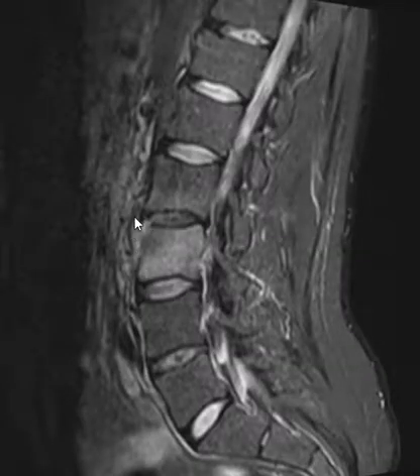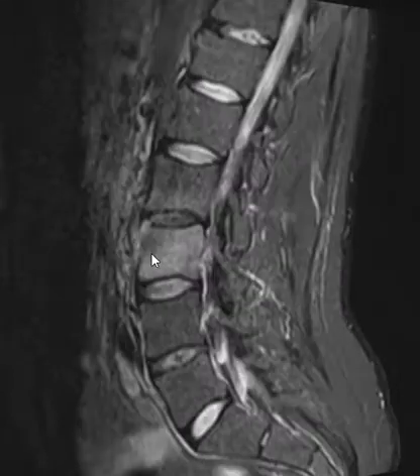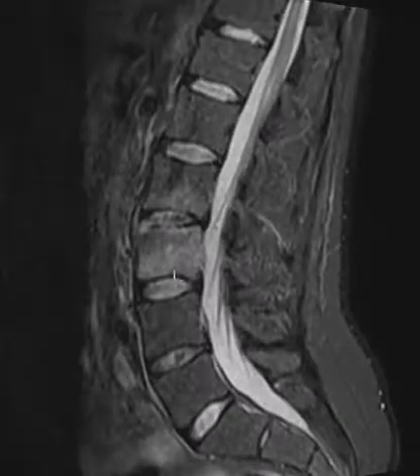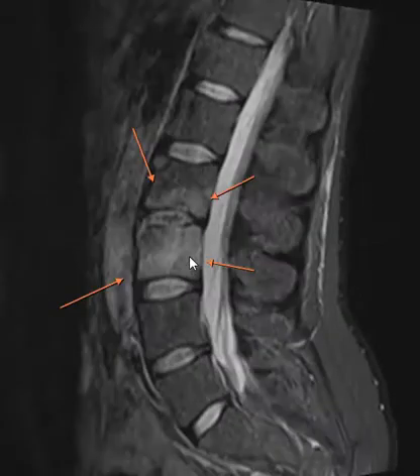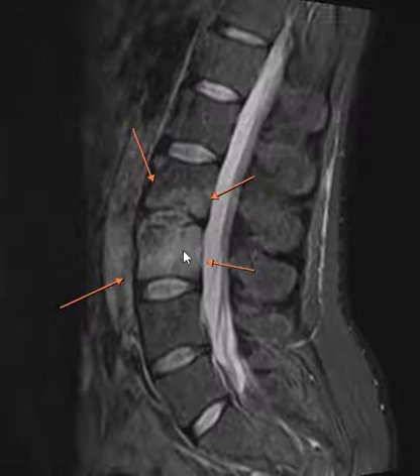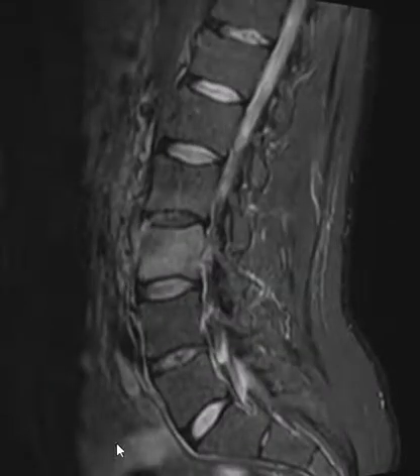The infection here looks like it goes anteriorly and over the L3 vertebral body. We talked to the patient's mother and found out that they were an IV drug abuser, and so we're like, yep, here we go. Discitis, osteomyelitis, and some infection into the anterior paraspinal soft tissues. So this is the first patient.